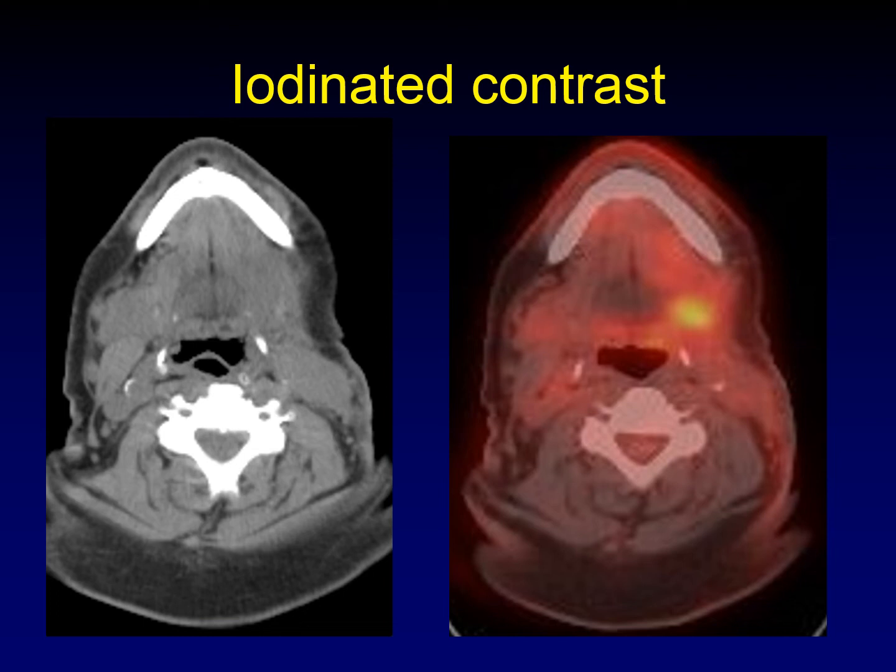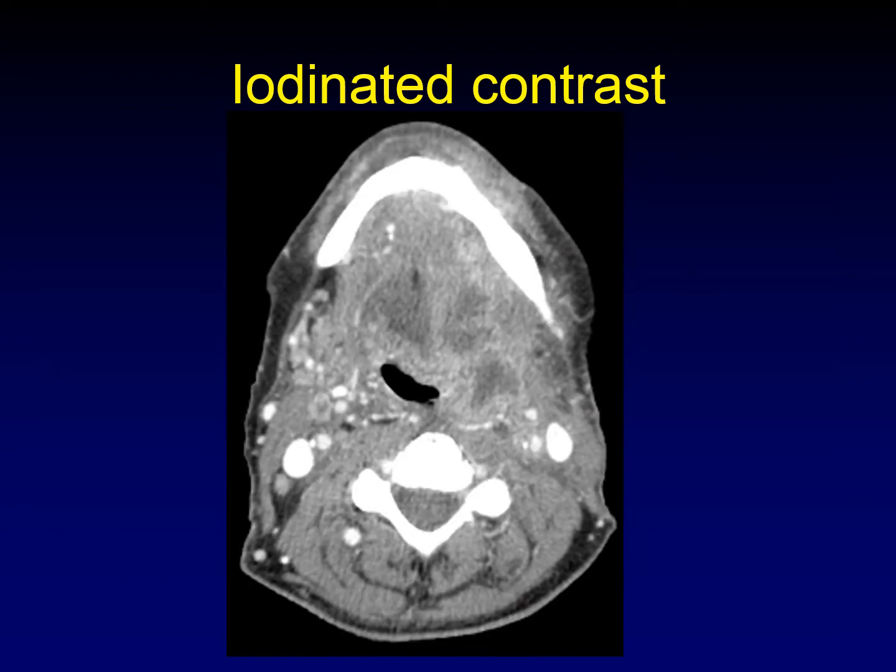This is a patient who had an attenuation-only PET-CT for surveillance, and there's an area of FDG avidity there, but really nothing seen on the unenhanced CT component. Probably just a little bit of granulation tissue in there. No big deal. Unfortunately, this is that same patient 3 months later. You can see that that actually was recurrent disease there, and it has exploded. Unfortunately, we blew it off because we didn't have the intravenous contrast there to inform us of that diagnosis.